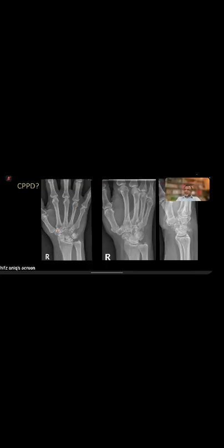So what do you think? How would you confirm? How do you go about it? Patient has wrist pain. We just call it osteoarthritis or CPPD, although treatment is not much different. But the rheumatologist wants to know whether this is something else or this. Yeah, maybe some SLAC, but not much. So the question is, is this CPPD? Yeah, you can do the elbow, very good. But where is the biggest cartilage in the body? Thickest cartilage? Knee, absolutely. Hip probably not, knee is probably the best, okay?